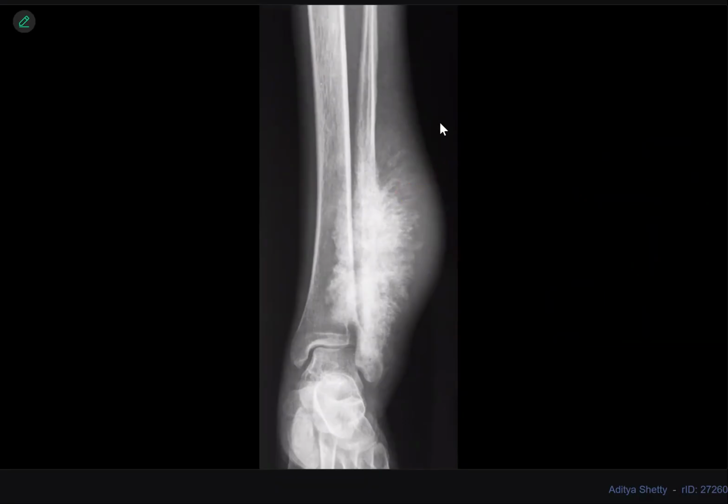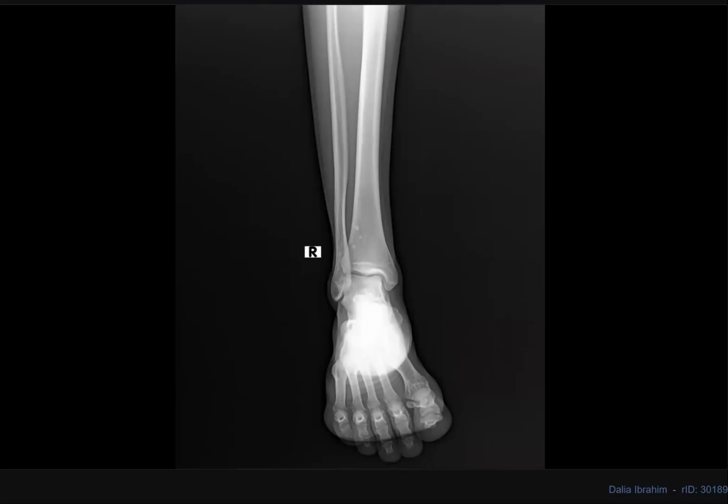During viva and also in short reporting, my friends, if you diagnose osteosarcoma or Ewing sarcoma, please discuss at the bone sarcoma MDT and biopsy at a specialized sarcoma center. No, this is osteosarcoma. It's a classic osteosarcoma. If you want a differential, Ewing, but less likely.